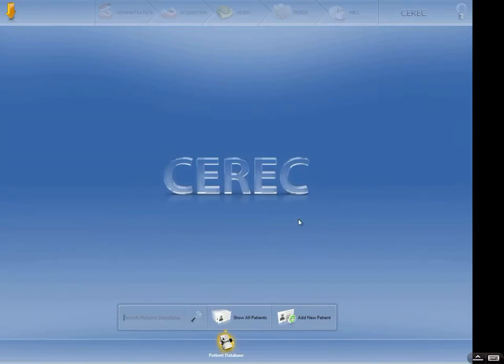Hello there, this is Dr. King. I'm going to go ahead and record me designing one of these inlays for the course.